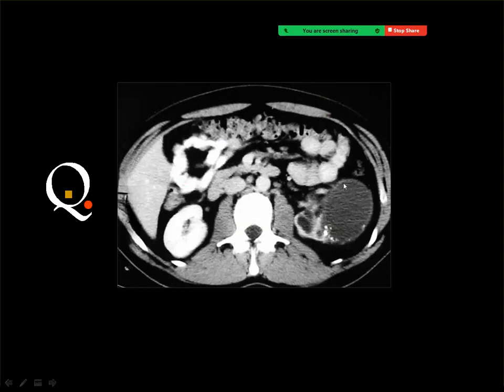You got a renal cyst with foci of marginal calcification, maybe in the wall of the cyst as well as in the renal parenchyma. And you remember that I have said that whenever you see calcium in the renal parenchyma with no evidence of masses or tumors, then you think of TB.